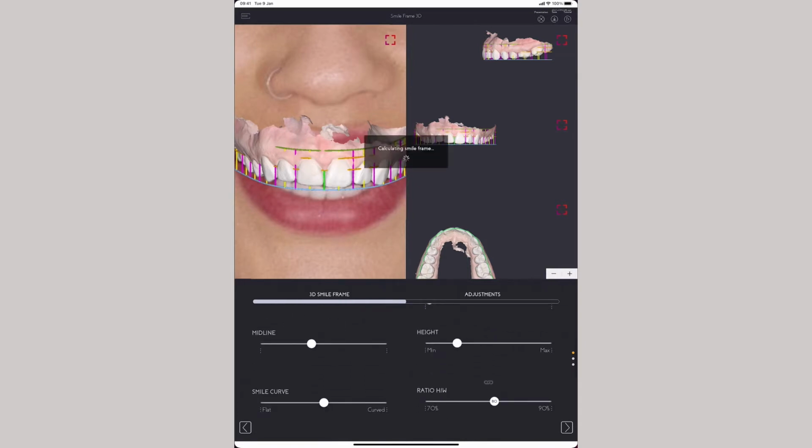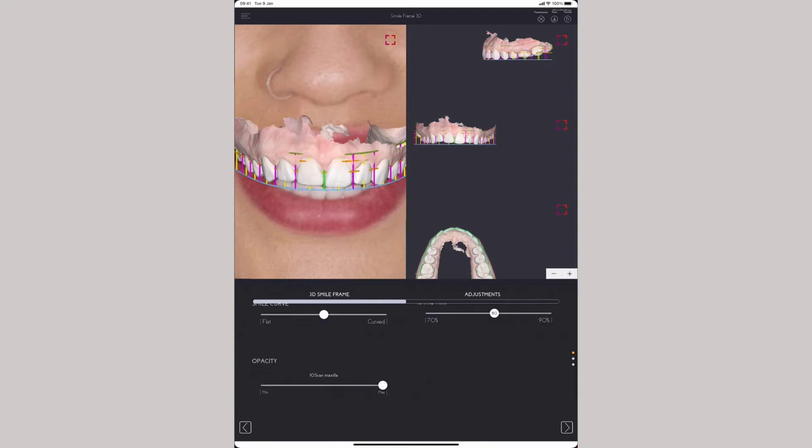The height is the green line, okay, the one on top, and take as a reference the centrals, but sometimes even the canines, the zenith point of the canines is the highest, right? And so normally it's canines, but you can take the centrals as a reference as well.